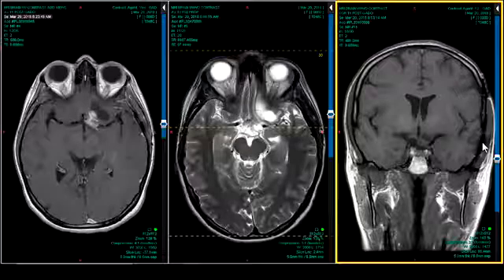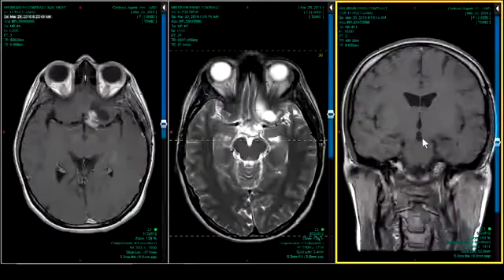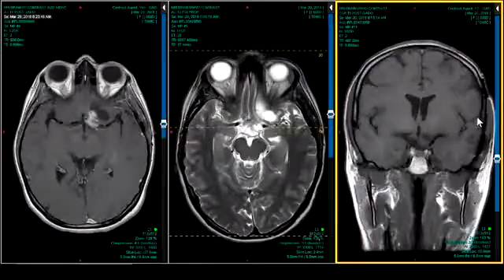So here's a craniotomy that's been done, right? So it's not like you just, here's a lesion, they make a hole over it and take it out, right? There's limited approaches to the brain, and this is a classic one. Your pterional craniotomy based on the sphenoid wing. You start with a burr hole right here, and that gives you access to the anterior and middle cranial fossae, okay? And then same one you would use for an aneurysm, and a pituitary suprasellar lesion, right? Because you can go through the sylvian fissure and use the fissures of the brain, okay?